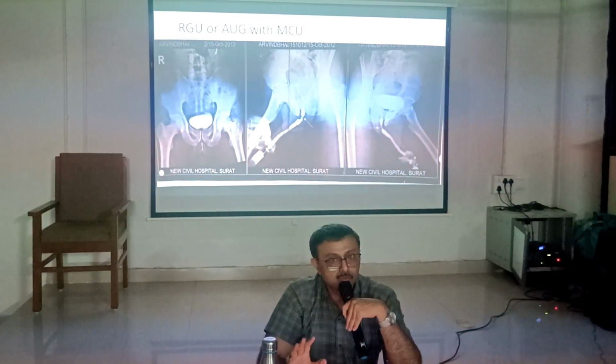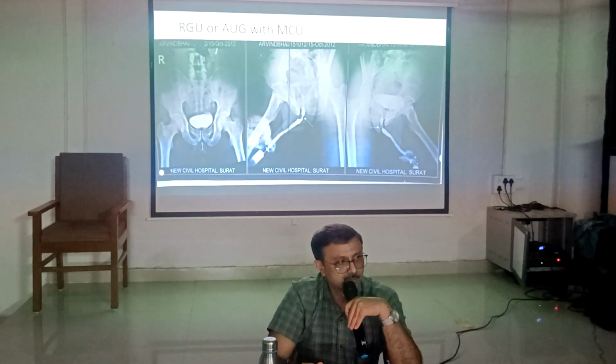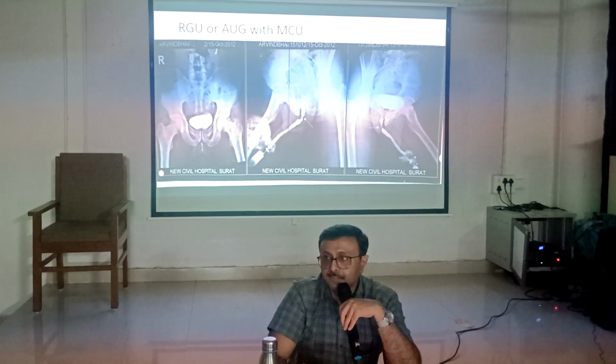So why are two required? Only ascending urethrography is sufficient. Is MCU necessary?